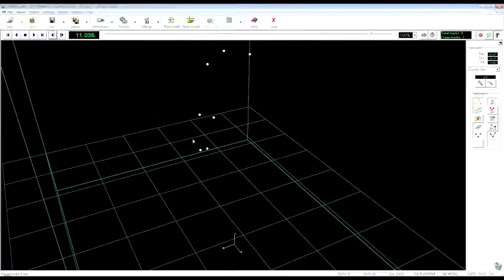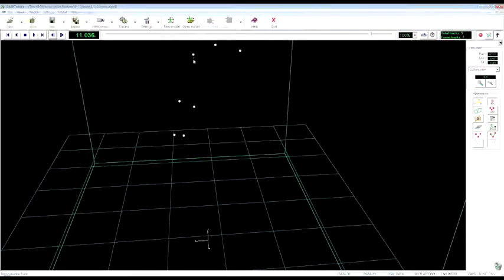The second required step following the 3D reconstruction is the labeling of the markers over the complete acquisition. That means that you have to assign a specific label to each marker trajectory during the entire duration of the acquisition. And this is mandatory if you need to apply a protocol to the set of the recorded markers. Imagine, for example, that you're going to use a given human body model and apply it to your marker setup. You have to pass to the model the information about the meaning of each marker, for example that you have one marker on the left acromion, one on the right, and so on.